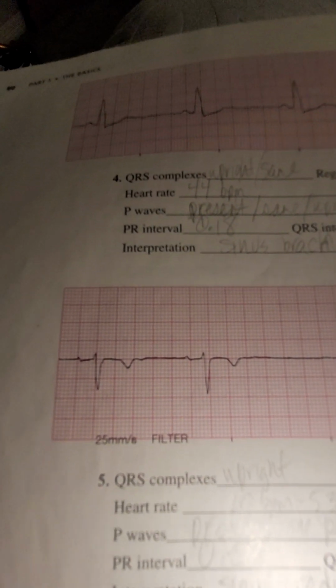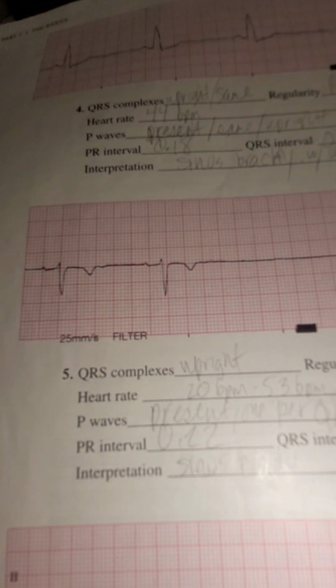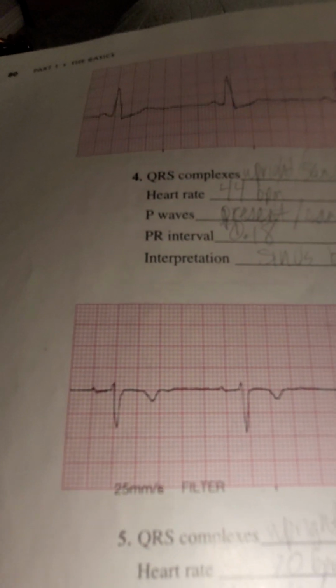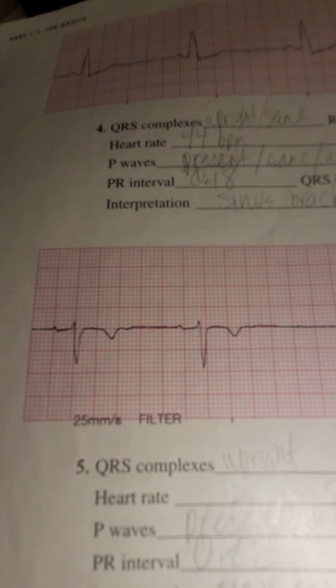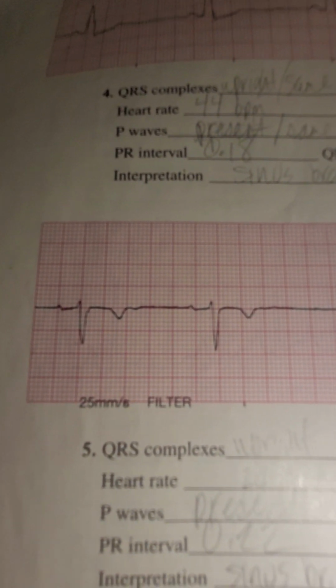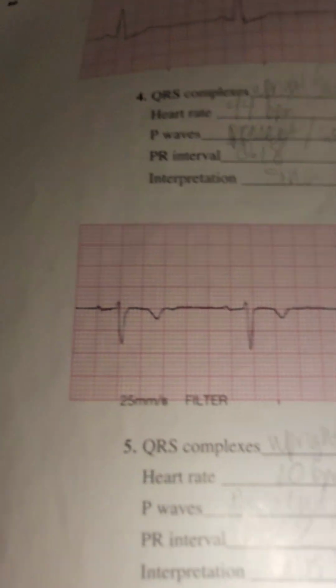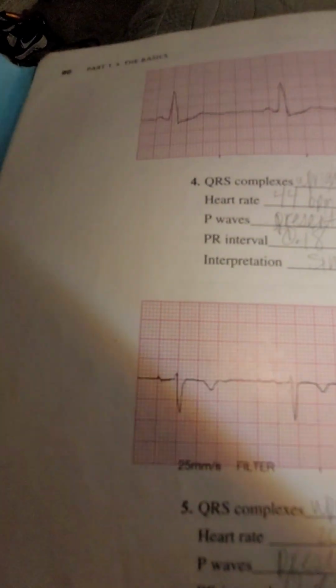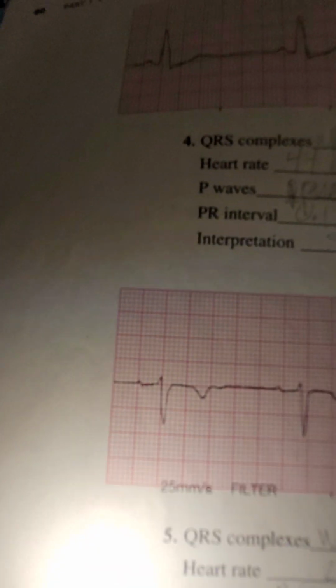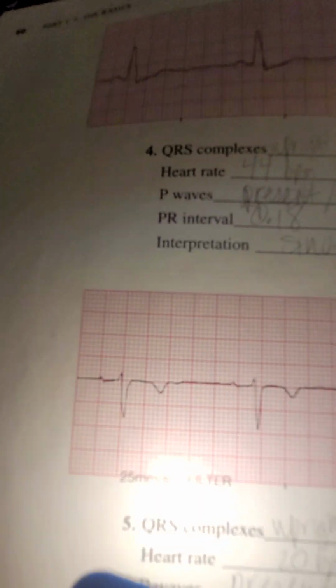This one, you could tell it's inverted. That's still okay. The P waves are up. That's just when it's like that. It's just one of those rhythms that is different. And like I said, I don't know why some of these rhythms are like that, but some QRSs might be like that. The only thing you need to be looking at, like I said, is still that they have a P wave.